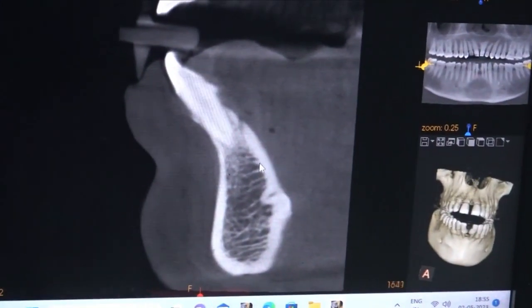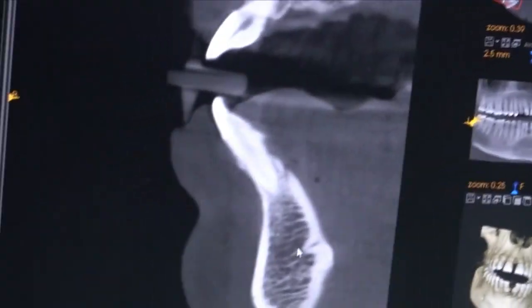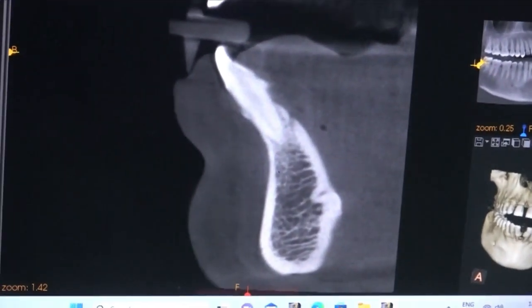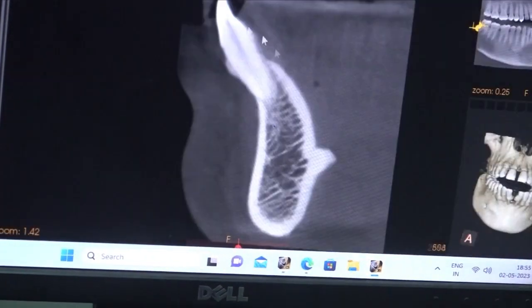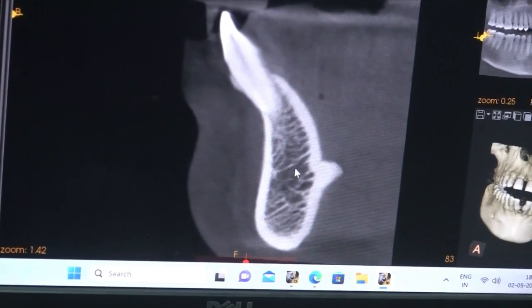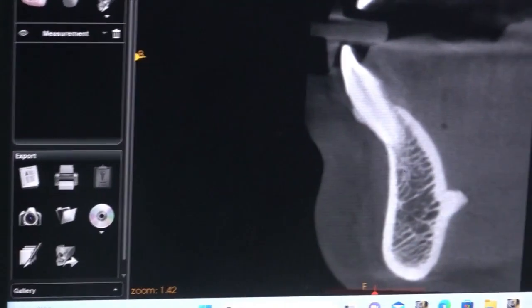So if you place the implant, then you check this number surrounding the implant, the bone value will be increased because it has compressed the bone. So here we will be placing compressive. Now we will be analyzing the 3-2. Here also the same scenario. Better to place a compressive, because if you place BCS here, it is only 60, 80. We won't get good stability.